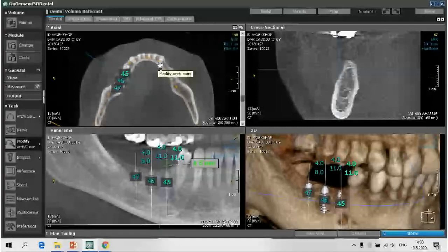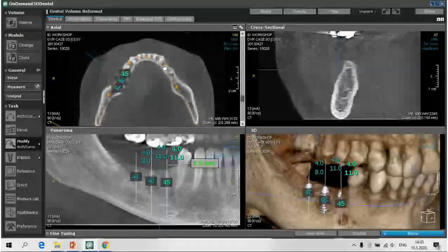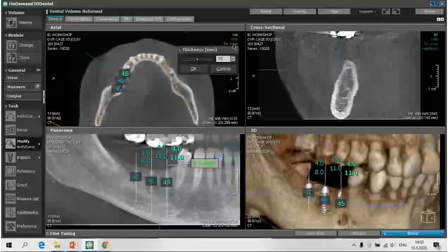And if we are, let's say, trying to modify just one part of this, if we have a curved arch here, and with more points of control, then it could show us the wrong picture on the right side of the screen. So when we are drawing the line, we could have a bigger thickness of the slides here.